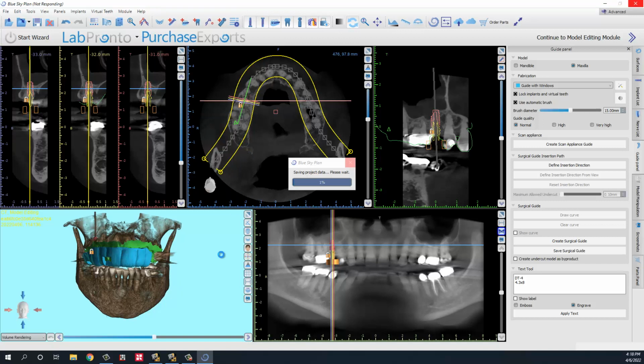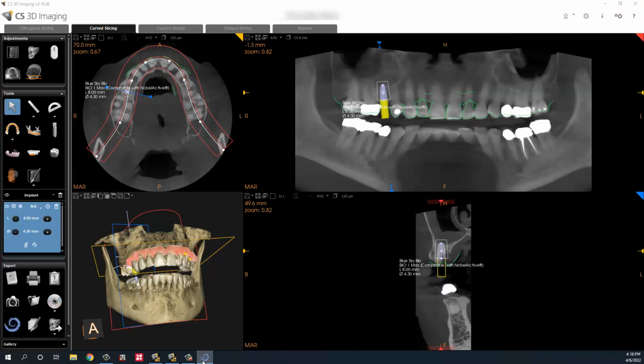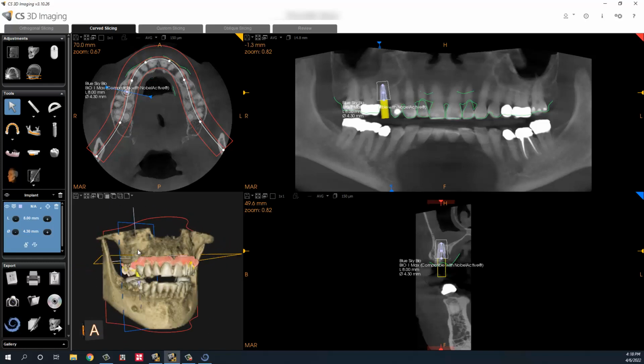It's saving right now, but now you can see the nice features of using Carestream imaging, because I can plan it in front of the patient, figure out where the tooth goes, and then when I can open it up, have one of my assistants or me later go on to actually design the perimeter of the guide and be out of here. So anyway, yeah, Carestream imaging.